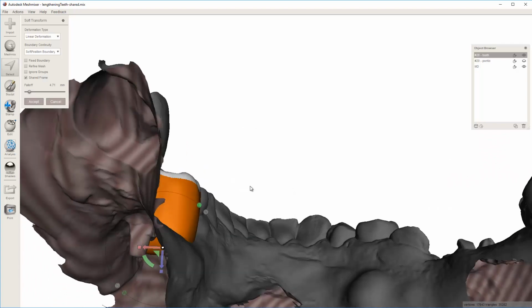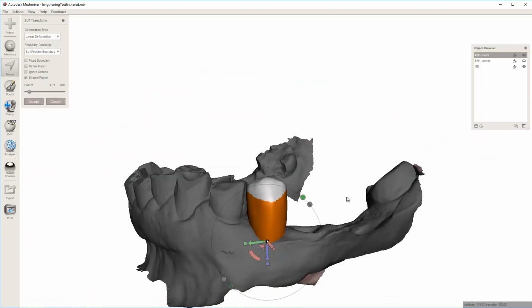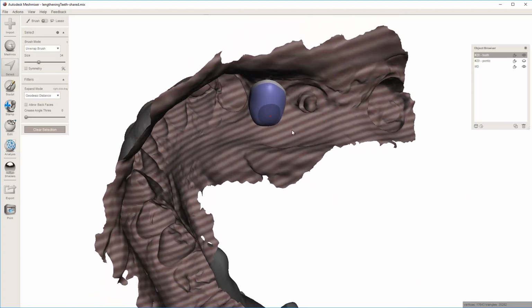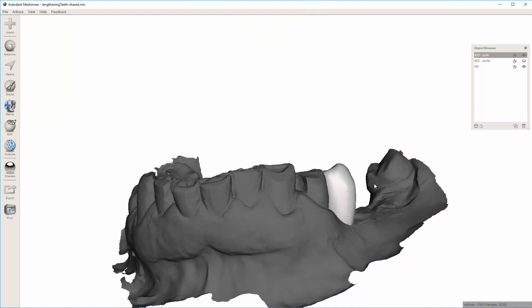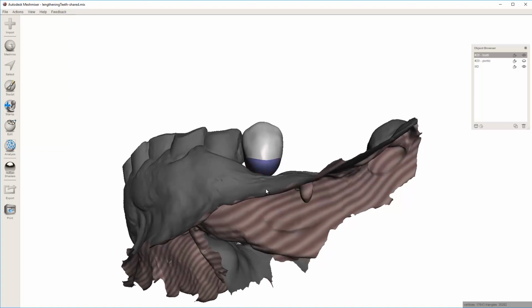So that to me is the first way to do it, and it's still sticking up a little bit right there. So there we go. Now we've got a slightly more rounded tooth, a little more ideal looking, I would say. And it's submerged within the model, so if you have this model closed as well, you're going to be able to have a printable model. So that's the first way to do it, is to grab that whole area.